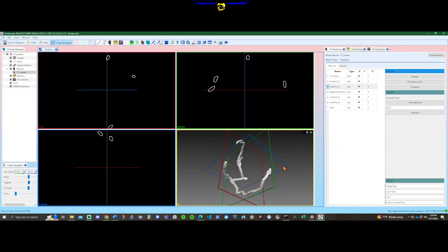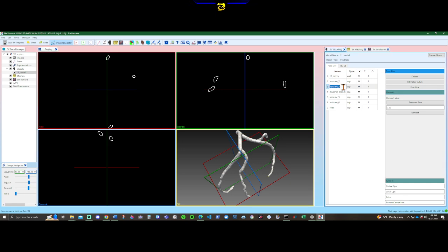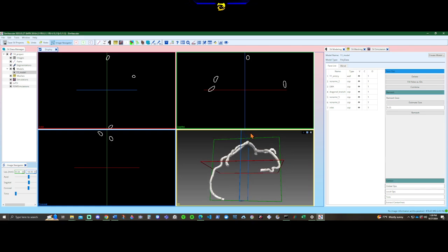This looks like also, oh no, here it is, okay. So that is the first one that kind of runs down. I think that's the left marginal artery, or LMA. Okay. What is this one? That's the one all the way at the bottom. That's the LAD.